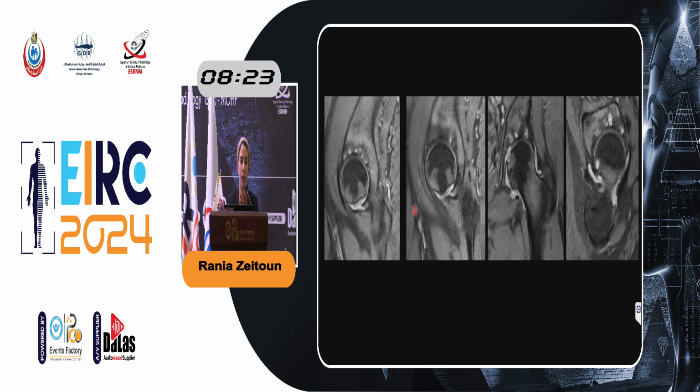MRI of a female patient: she had a labrum tear and she had extensive subchondral bone cysts and erosion-like lesions all through the acetabulum. So the first impression was query degeneration, query early osteoarthritis. But whatever is happening here on the acetabulum side is disproportionate from what is going on at the femur side, and it is also disproportionate to the amount of joint space reduction and loss. So we had to shift our thinking to another possibility.